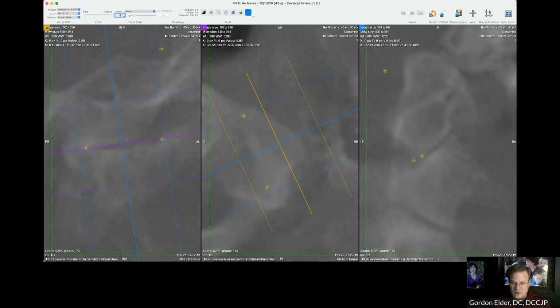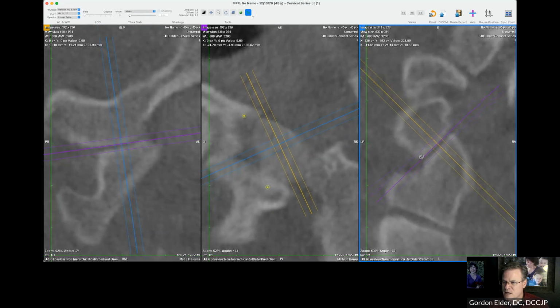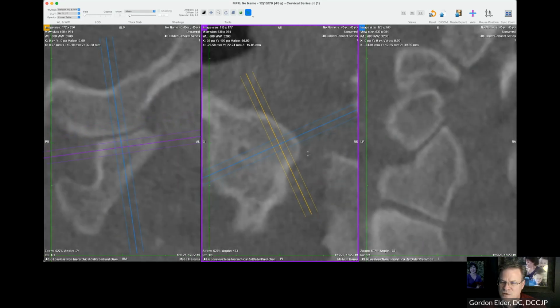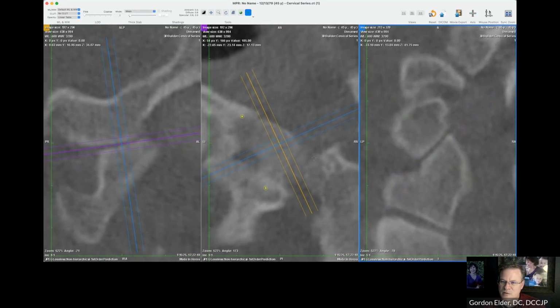Let's go down to 3 millimeters. What radiologists tell me is the smallest measurement, smallest slice you want to get a clear picture. Start seeing too many imperfections. All right, and we're going to make sure that over here we're still balanced. Here it's kind of hard to see where we are in the joint. There we go. Let's see. So I'm going to make sure that we're actually in the joint before I get rid of that.